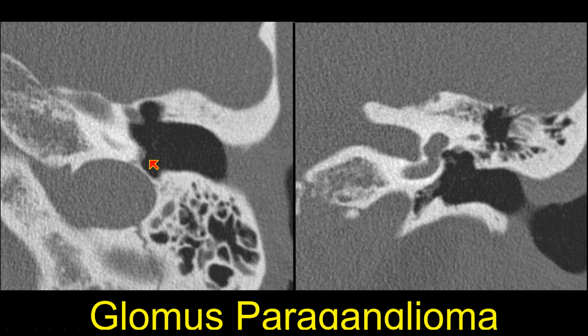But if I don't have that clinical information, I could clearly miss this patient. So if I get this study and it says rule out abnormality, I might miss this. But if I get the clinical information that there's pulsatile tinnitus and a small red mass behind an intact TM, I might be able to make this finding of a small glomus tympanicum in this case.